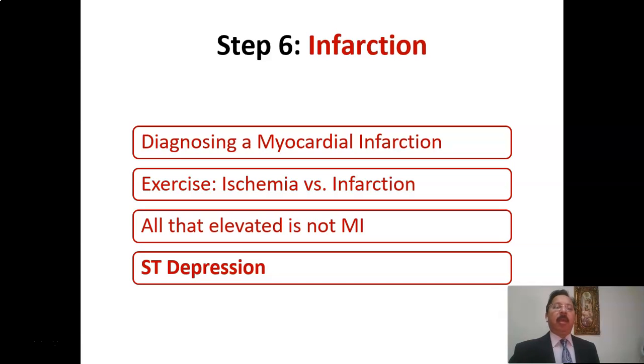Okay, so we have finished so far the myocardial infarction, that is the ST segment elevation, and then we have gone through exercise, ischemia versus infarction, and then we reviewed some non-STEMI causes of ST segment elevation, and now it is time to review ST segment depression.